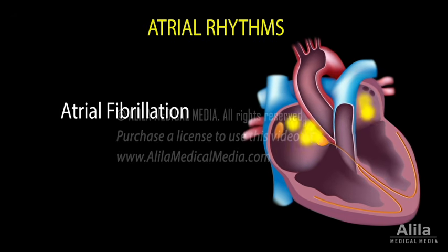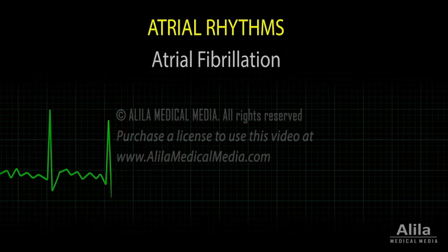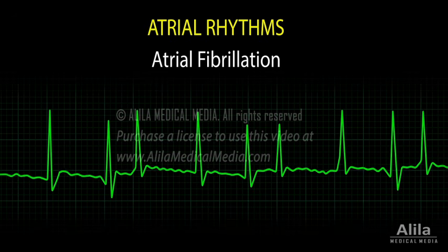Those that do come through are irregular. Ventricular rate is therefore irregular and can range from slow, less than 60, to rapid, more than 100 beats per minute. On an ECG, AFib is characterized by absence of P waves and presence of irregular narrow QRS complexes. The baseline may appear wavy or flat depending on the number of ectopic sites in the atria. In general, a greater number results in a flatter baseline.